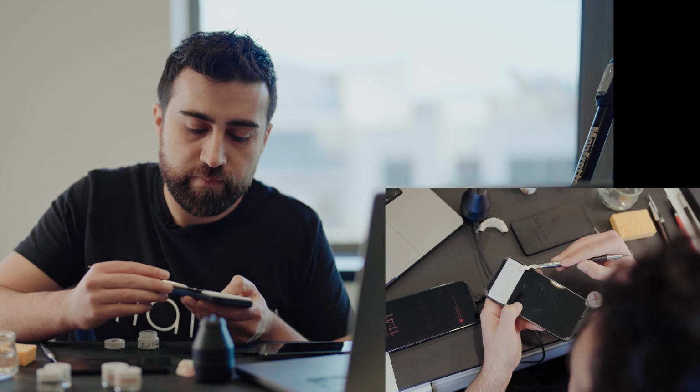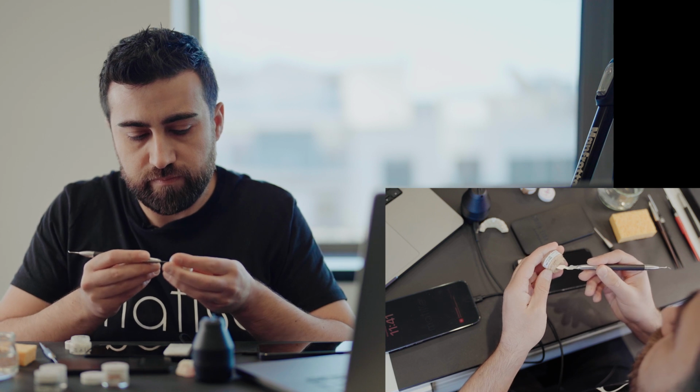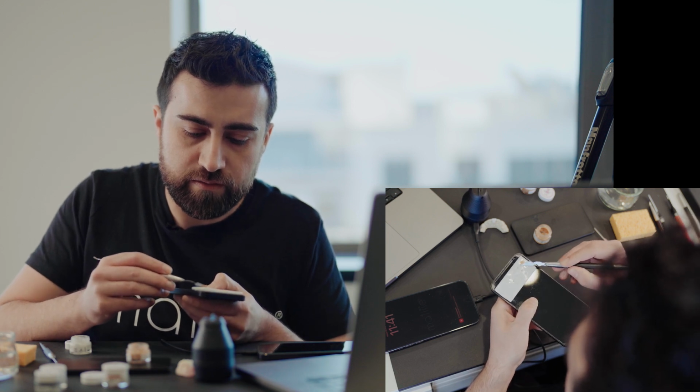Make sure you fill it correctly. So it's very easy, intuitive. So this is for the LV. Now I need LB as well. So I need to fill 3 gaps. 1, 2, 3.